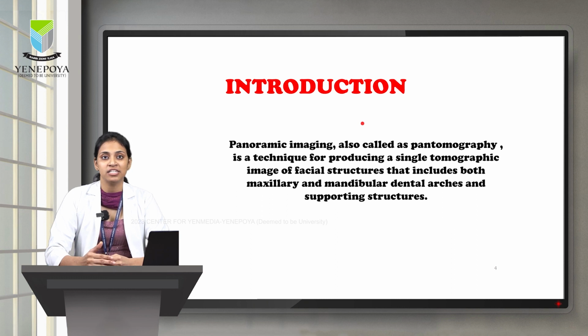So, it is advantageous in cases where we need to assess a larger lesion where it is not captured completely by an intraoral periapical radiograph. And secondly, in cases where the patient requires multiple radiographs, panoramic imaging can be done.